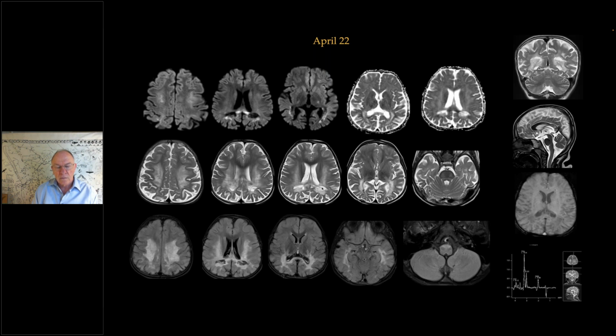And what you're calling cavitation is also calcified, right? Is there calcification as well out there? This is SWI. Second picture, lower panel. What is that dark bit? This one? Yeah, and below that. So this is the FLAIR.